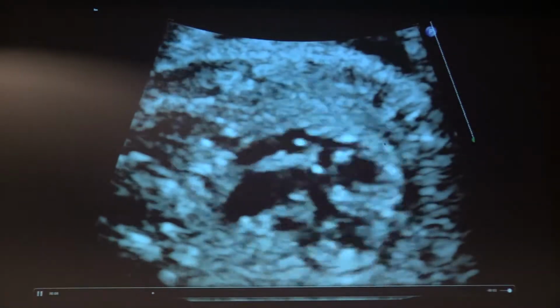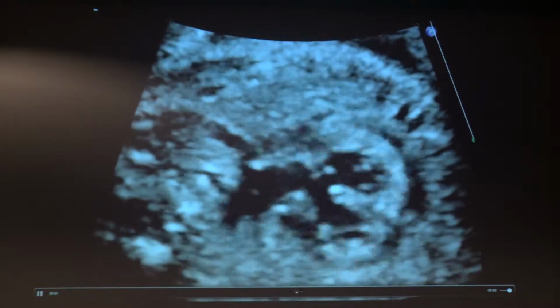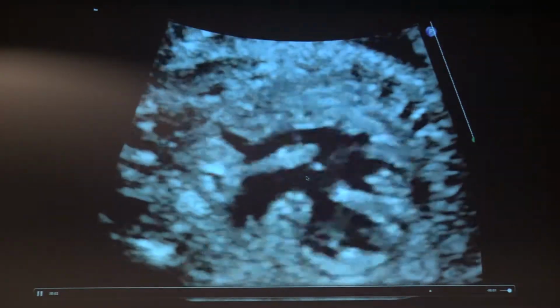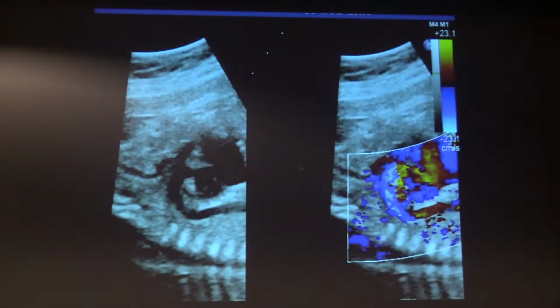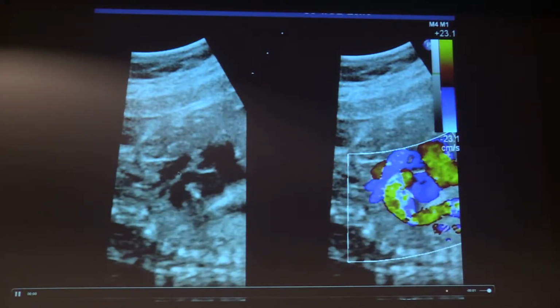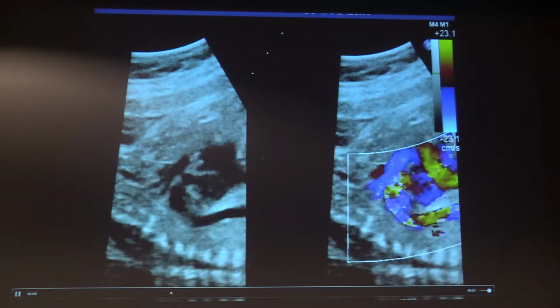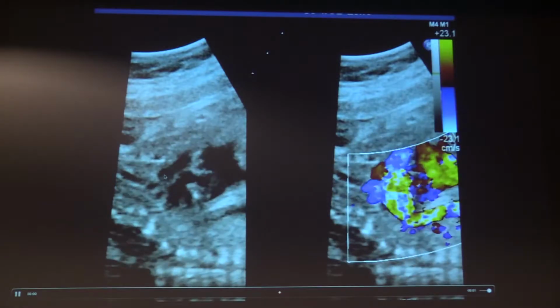Examples. So in this case, what we can see, this is the right ventricle, this is the left ventricle. We can see this is the aorta arising from the right ventricle, and the pulmonic is overriding on the VSD here. If we look carefully, this is the aortic arch, and you can see here that there is an interrupted aortic arch. This is in color Doppler mapping, and this is with 2D. You can see there is an interrupted aortic arch.